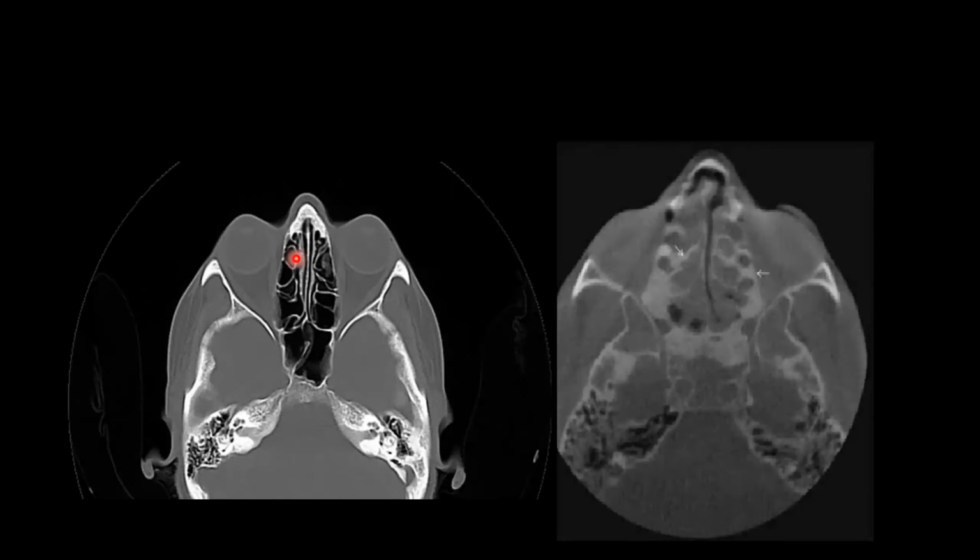On your left side, you have seen this slide many times: frontal bones, zygomatic bones, greater wing of the sphenoid, sphenoidal sinuses, ethmoidal air cells, and what is this? Nasal septum. On this side, they are not aerated. They are not as dark as this, because as you know, on CT the airways look dark. They are opaque. So there is mucosal thickening, there are secretions, so there is inflammation. So this patient is having sinusitis of the ethmoidal cells.